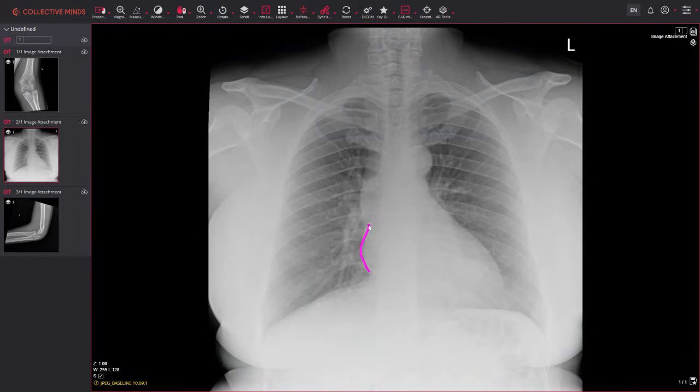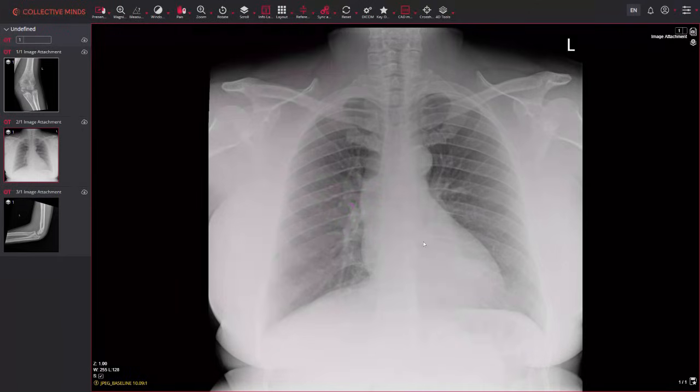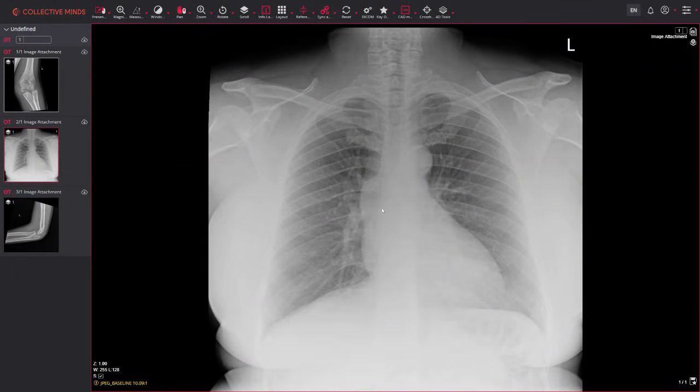So we go around the heart, we look at the hilar regions. These are the hilar regions here where all the main vessels come out from the center. There is something called a hilar angle here, which is an angle between the vessels. And really, all that is just to show that if there was a mass or any lymph node enlargement, you would have an outbulging of soft tissue here and you would lose this angle here. You don't need to go into detail on anything like that.